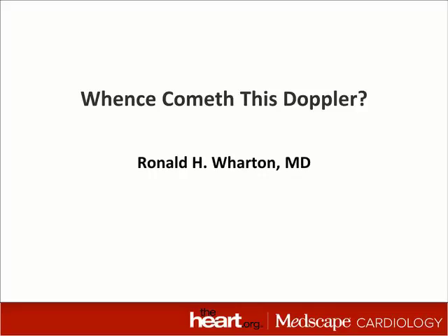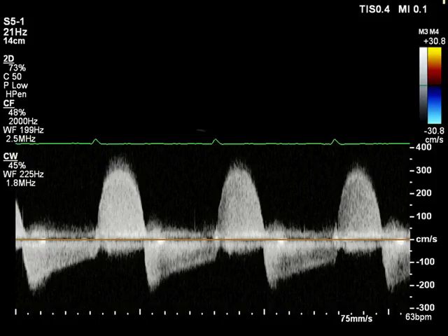This is Dr. Ronald Wharton at Montefiore Medical Center, and I thought I would show you an interesting Doppler and see if you could figure out where this Doppler came from in the study. So if you look at the first slide, you see a continuous wave Doppler signal with both a dense systolic and almost as dense diastolic signal.